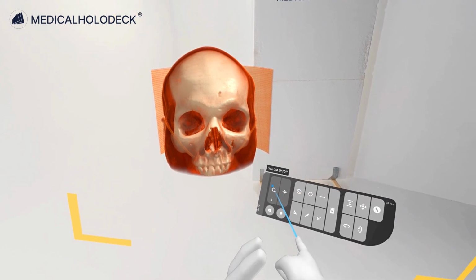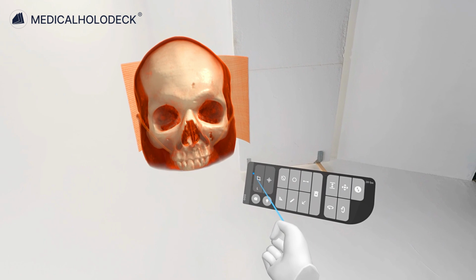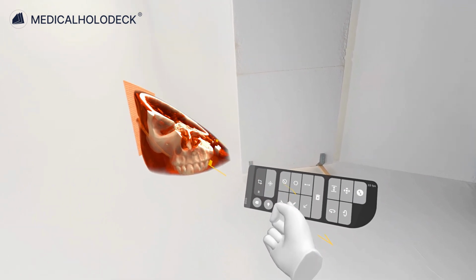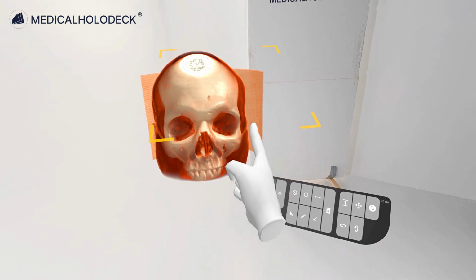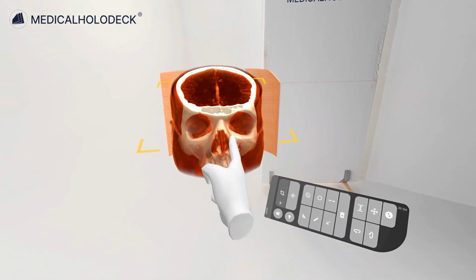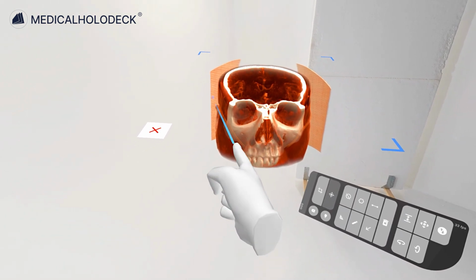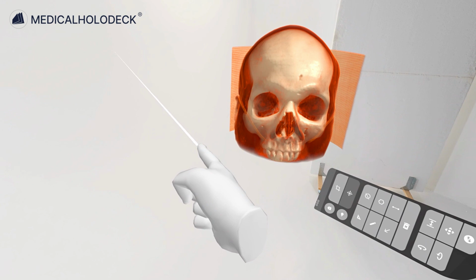Select it from the pad using the right trigger. The cutting tool will activate on your left controller. Press the trigger again to switch it to the right. To preview a cut, move your hand into the dataset. Pull the trigger to finalize the slice. To remove a cut, click the red X icon.